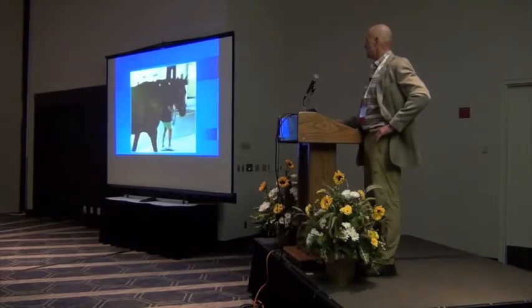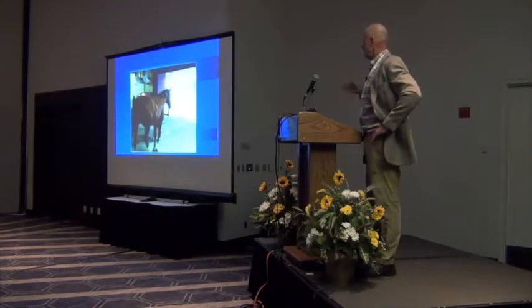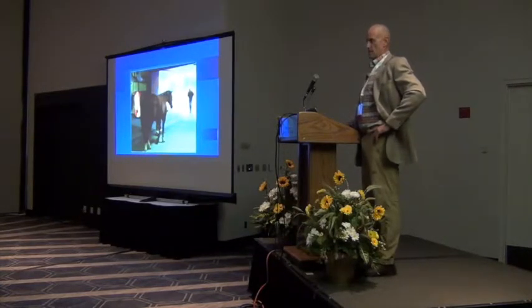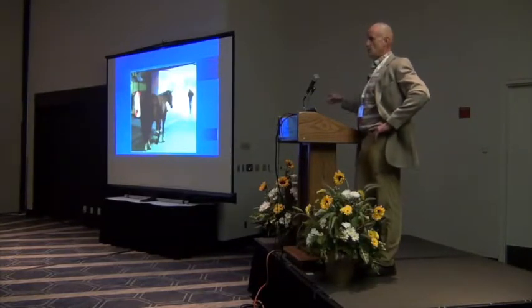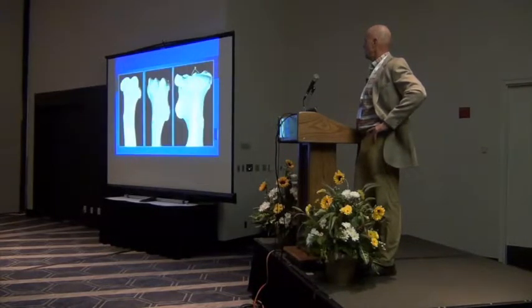It's not as dramatic as what you would normally see, but it actually pops out, and that's evidence of suprascapular nerve injury. And things have changed a lot since I got out of vet school and was trained as a surgeon. We always wanted to do something for this, and now I've learned this condition is probably better left alone to allow conservative management, because a lot of them will come back and do fine on their own.